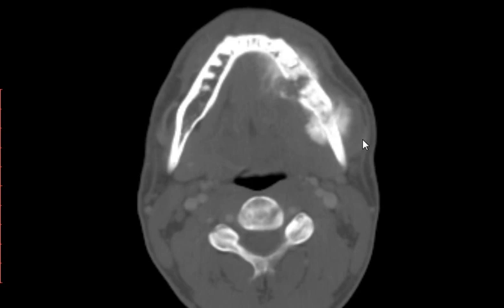Possible but unlikely. Chronic osteomyelitis might, but the sunray is not in favor, and the soft tissue component is not in favor. If it's chronic osteomyelitis, it will fistulate to the skin, which we don't have. And he will have fever and recurrent infection, recurrent swelling and de-swelling. Not like this. It's arising from the bone, destroying the bone, with surrounding soft tissue components and a sunburst periosteal reaction.